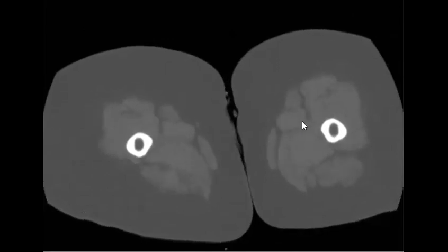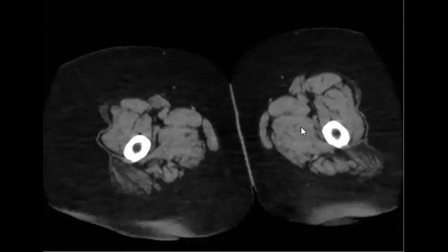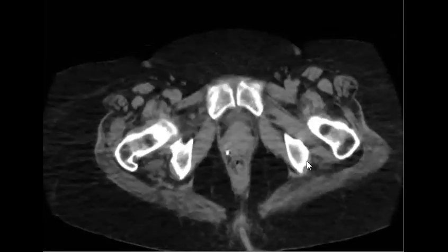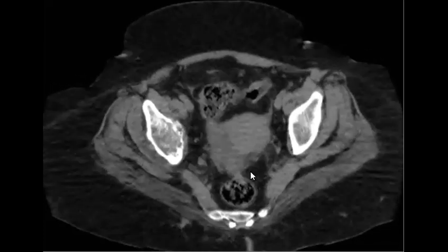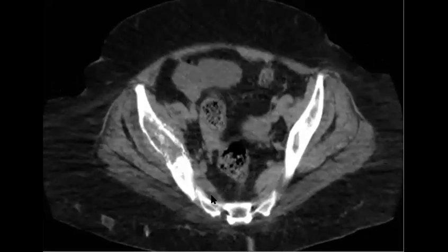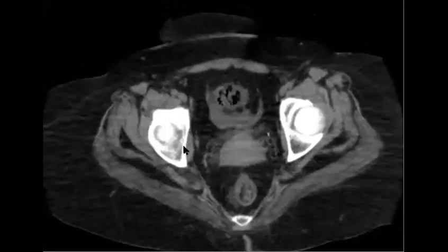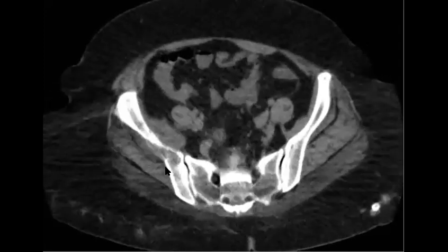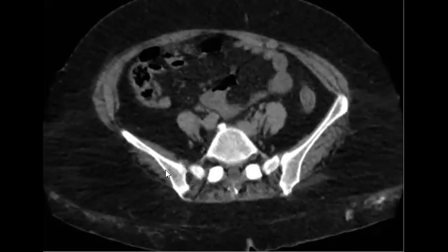Okay, yeah, nice that you mention, Ines, that you will search for skeletal lesions in the other bones, but until now we didn't find anything. So soft tissue component, I agree with you. And as you see here, yes, the soft tissue component is obvious, and lytic lesion. And you should also describe if it is reaching the articular surface or not, because I think it will affect the management if this patient has just this single lesion, okay? So you should mention this.